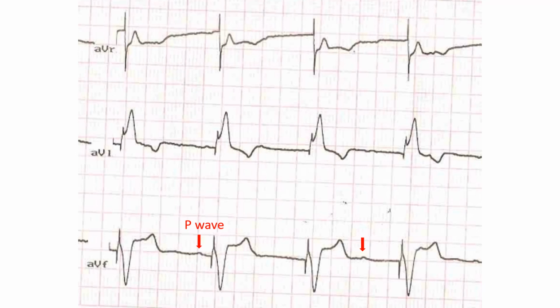Inferior leads show negative QRS complexes indicating an activation proceeding from below upwards, suggesting the location of the lead tip in the right ventricular apex. The axis will be downward in outflow pacing. Left ventricular pacing will give a right bundle branch block pattern. Pacing of the septal aspect of the right ventricular outflow tract is being used by some as a possible way of more physiological pacing in terms of activation sequence of the two ventricles, mimicking the natural sequence.